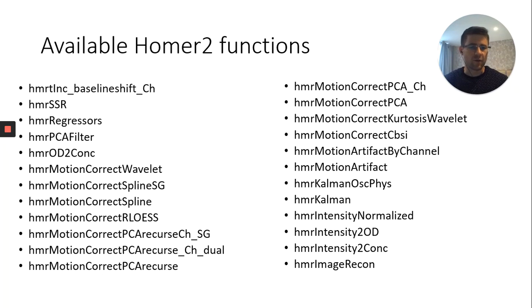So I went through each of the function names just to give everyone a list of what functions are available. And also keep in mind that I haven't gone through each one of these exclusively, so there might be one or two that don't work with this function call. But I wanted to show in this video each function that is available.